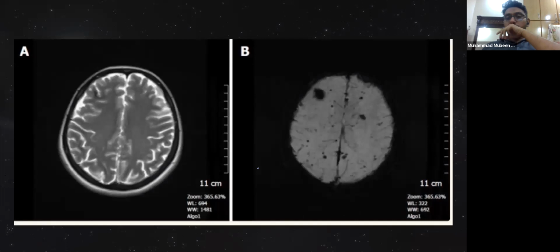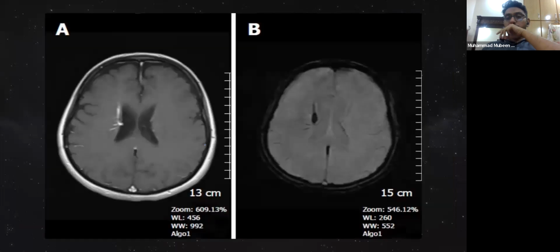Here is an example of how SWI helps to identify different vascular lesions. On these T2 weighted images, you can hardly see this focus of cavernoma, which has a hypointense rim and a central hyperintensity. You might miss that when you're looking through many images in a row, but seeing it on the SWI images, you can readily identify that there is a lesion. Apart from that, there are also a few other areas which might need another look in the T2 weighted images to see if there is another lesion present or not.